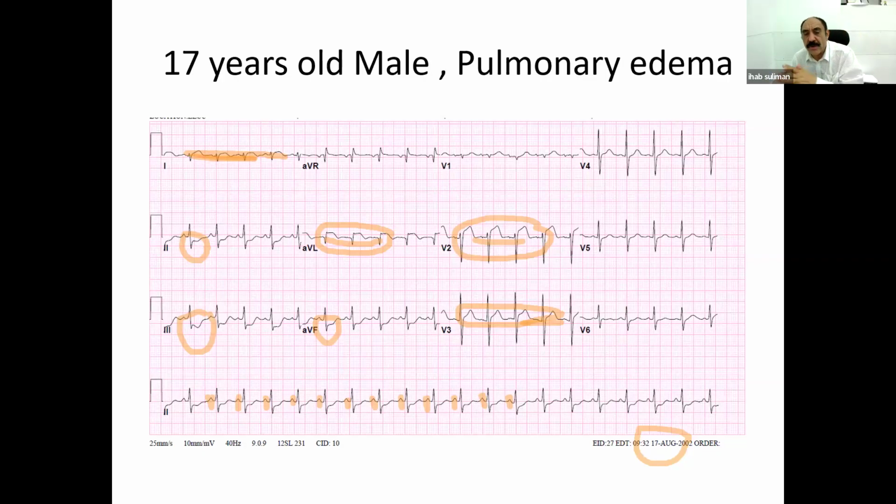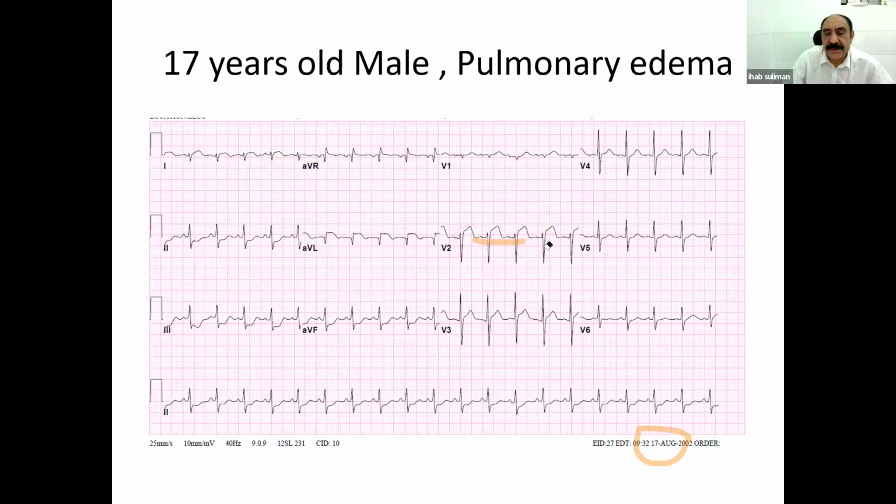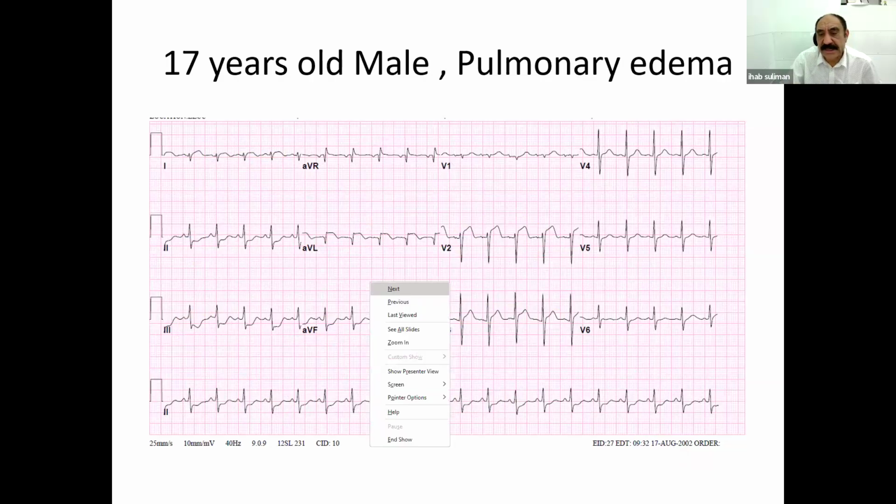This is acute myocarditis, which can have very funny or bizarre ECG. So this is the one, and it could be also a diagonal infarction, but the patient did not have any diagonal occlusion. So this is a patient who has acute myocarditis, but he came like an ST elevation scenario. Remember, myocarditis or myopericarditis sometimes can have a very variable ECG presentation. So let us move on to another example.